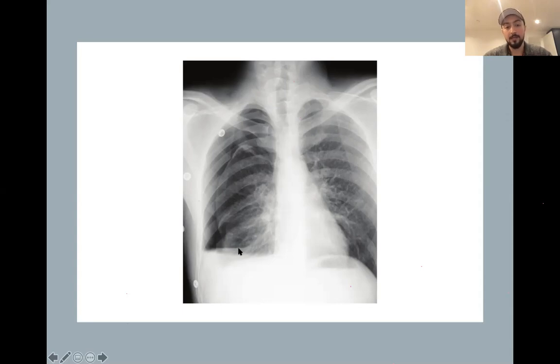And the difference between this and the pleural effusion is that the fluid in here is building up in the thoracic cavity and not in the pleural cavity or the pleural membrane. Whereas in the pleural effusion, it's building up in the pleural membrane. That's why in pleural effusion, the fluid forms a C shape or a meniscus sign. Whereas in here, it just builds up normally. Like you're, for example, putting some water in a bottle, it will be very flat. Okay.